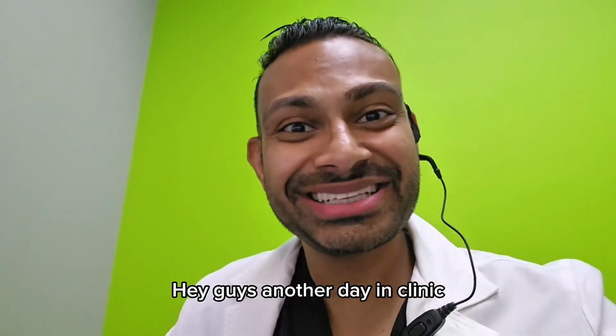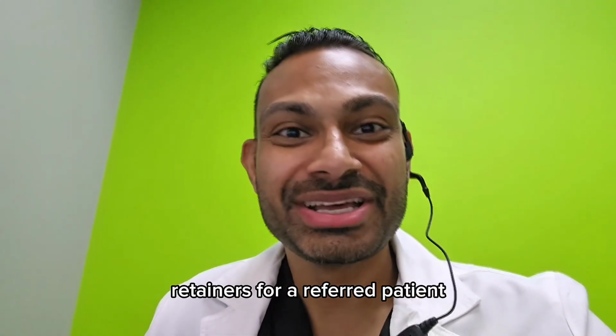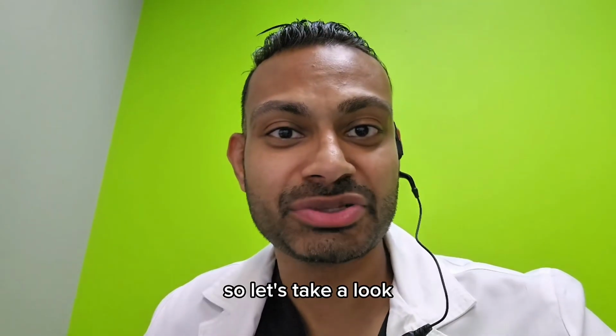Hey guys, another day in clinic and another day of designing new Ortho-K retainers for a referred patient. So I want to actually show you how my design process works, and I'm going to use the Wave software today to design a custom Ortho-K retainer. So let's take a look.